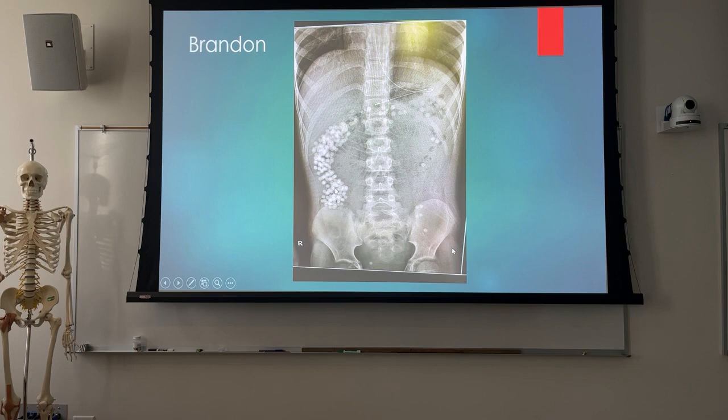Did you ever find out what these were? They never said, and even in his records, they never said what it was. They claimed it was pomegranate seeds, but I don't think it was. The kid was autistic. He ended up just passing it through. They filled it up with gastro and did a therapeutic enema, and he ended up passing most of it. He didn't need surgery.